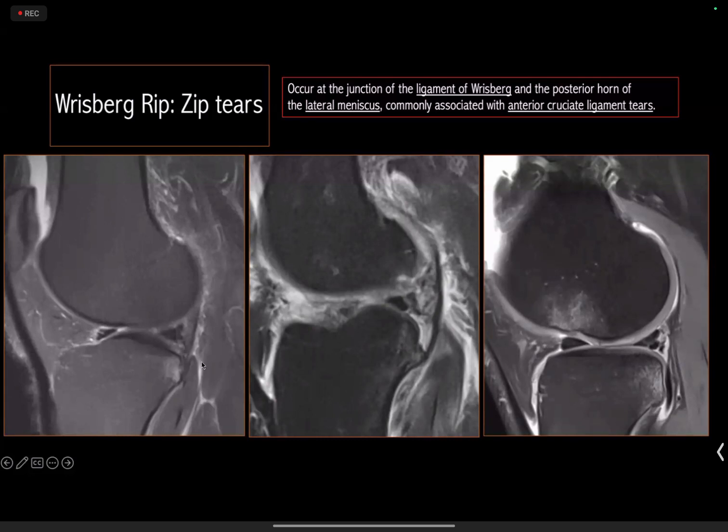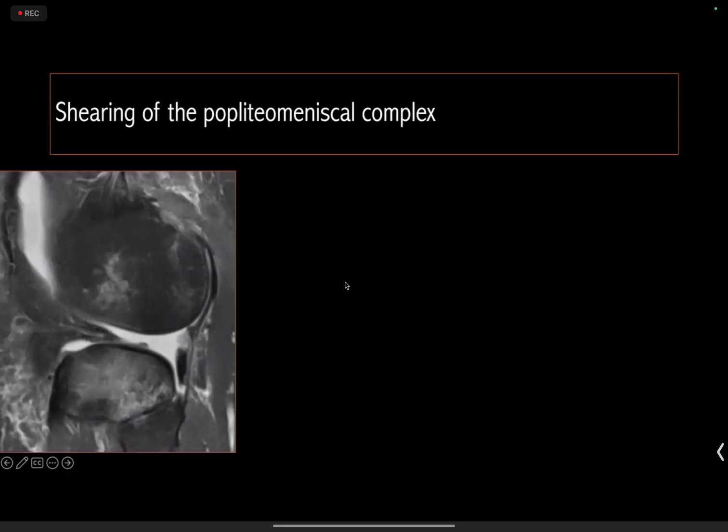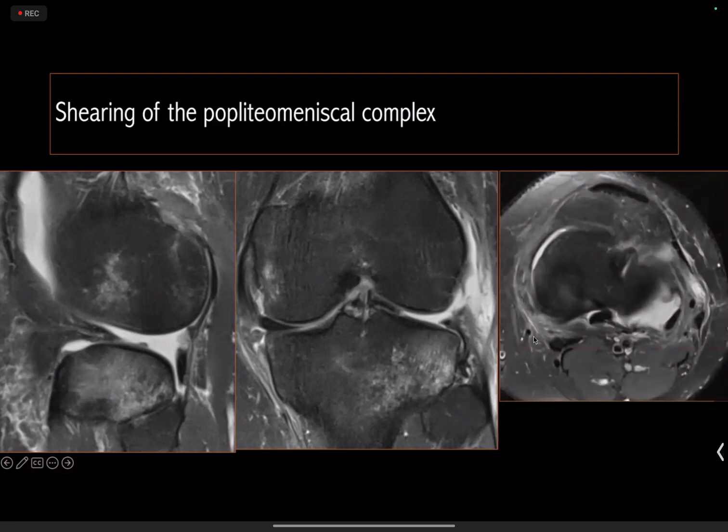As we gradually look, we would find that the soft tissue and the meniscocapsular attachment injury, together with injury to the fascicular bands of the popliteus tendon, would also be seen, a common accompaniment with ACL injuries. So the shearing of the posterolateral corner, the popliteus and the lateral meniscus would be seen more efficiently if it is accompanied by fluid supporting or surrounding them.